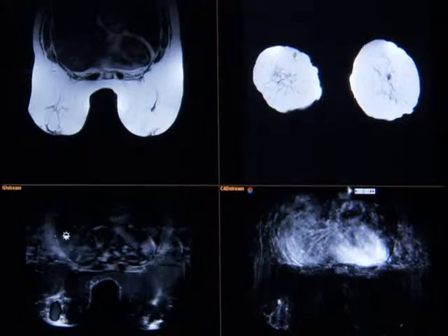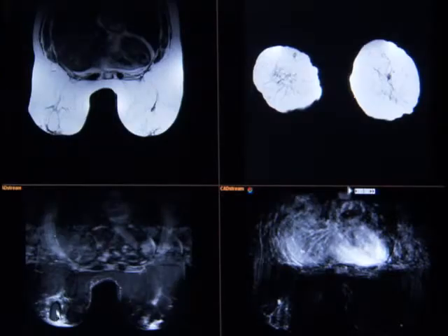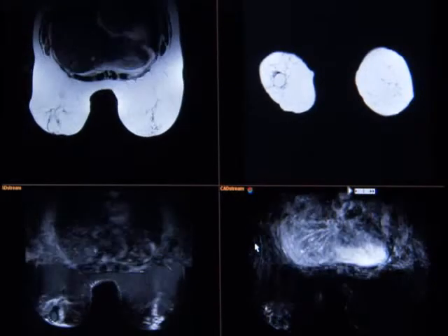Inferior to that is a STIR acquisition, very sensitive to edema. You can see the edema around the cavity and also see from the signal characteristics that this is a complex cavity, likely with hemorrhage within it. We then have a high-resolution coronal acquisition. Again, you can see the biopsy cavity in this region. And then once again, you have many options as to what you want to put here. We chose to do a thin MIP image of the 1-minute subtraction acquisition. Again, any one of these that are involved with a dynamic run, you can apply the color parametric map to.